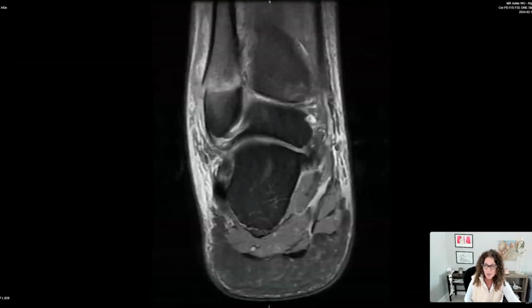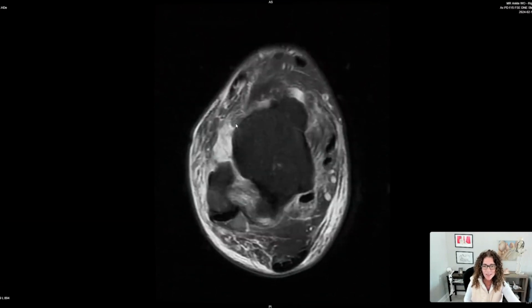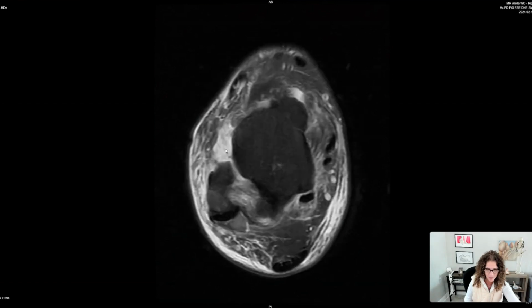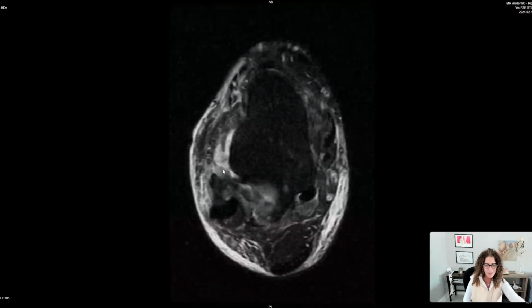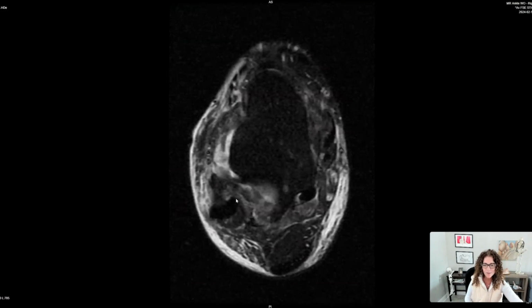Moving down to the lateral collateral ligament complex, let's take a look at the ATFL. I see no ATFL. I see bulging of synovitis through that region. Maybe there's a part of the ligament there. Looking at the PTFL, I see sprain and synovitis. Let's see how that looks on STIR. STIR is always going to underestimate, sort of diminishes it, but nonetheless, when you have a full tear, I think it sees it very nicely, with the fluid coming right through that complete tear of the anterior talofibular ligament, sprain of the posterior talofibular ligament, and let's take a look at the calcaneofibular ligament.